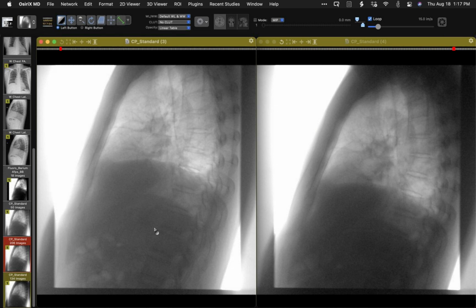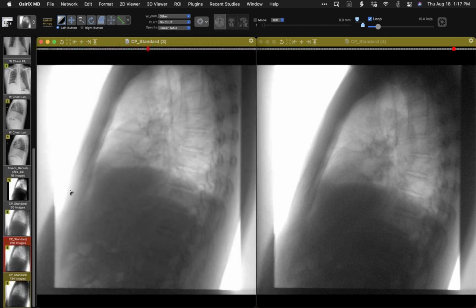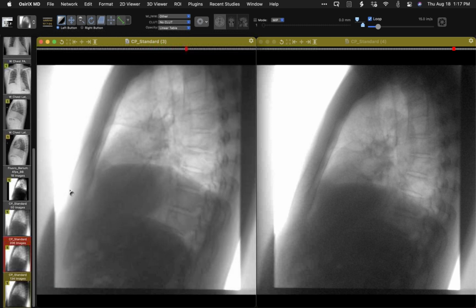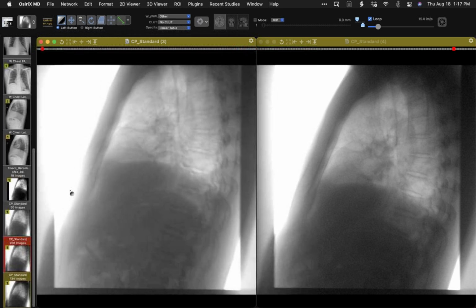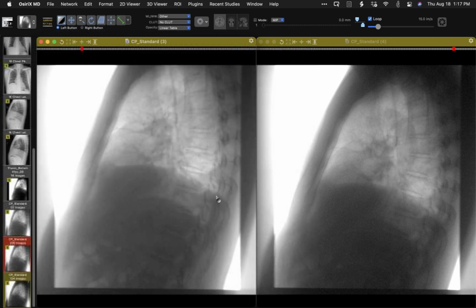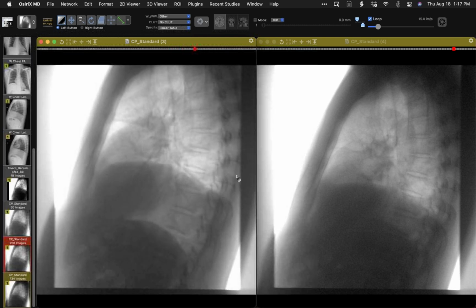Yeah. But of course, for the totality of this case and all the other findings, pretty sure that it's a phrenic nerve problem. Yeah. So the critical thing for paralysis is the lack of motion on that slow, deep inspiration. That's what establishes paralysis. I'll just play that one again. It just sits there. Nice example. Right. And as opposed to eventration, the elevation goes all the way to the posterior chest wall. So that's characteristic of paralysis. Yep. Eventration could have some anterior elevation, but normal height or approaching normal height posteriorly.